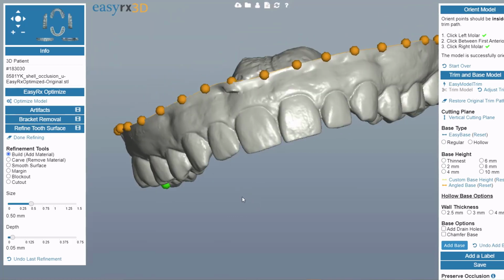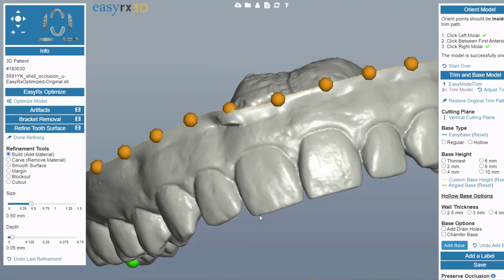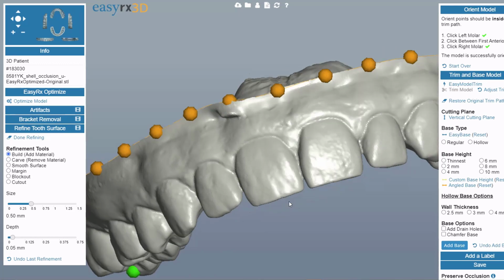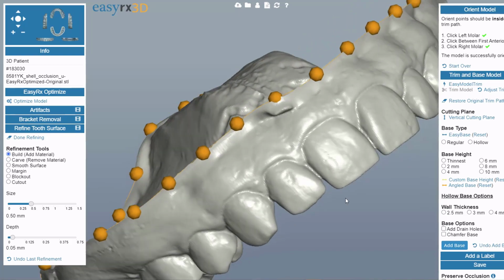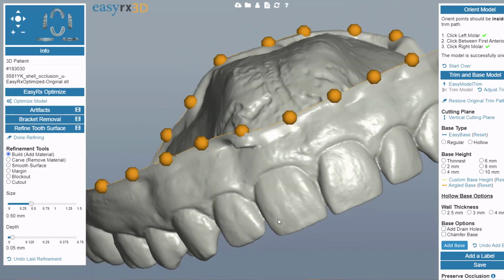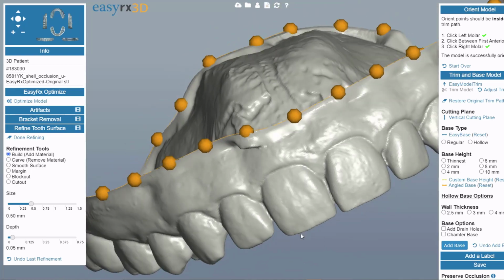So to show you what that can look like, I'm going to pick build. So here's the current build default. And I'm holding down the shift key and dragging with the left mouse button down. And so that's 0.5, 0.05. You'll also notice we've improved this process, so the actual build or cut in is going to be a little bit more smooth to make for a better outcome.